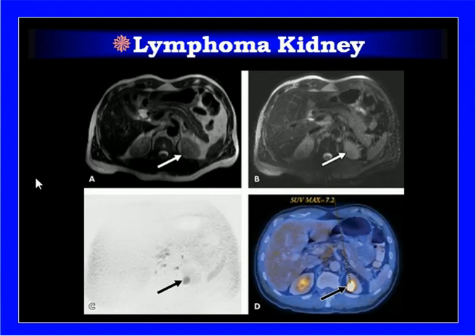Now these are the axial images of the abdomen taken at the renal level. You can see a lymphoma with different densities, the MR image, the CT image, and the nuclear study. So we can see the same lesion in different modalities.